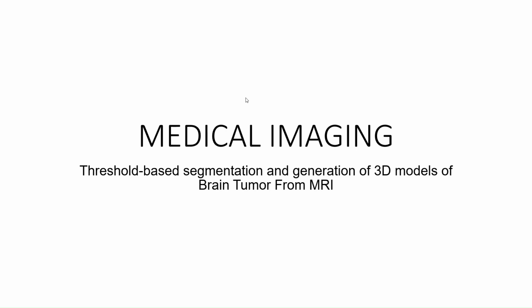This is my medical imaging assignment: threshold-based segmentation and generation of 3D models of brain tumor from MRI scans. In this video, I will be thresholding brain tumors from MRI scans using normal threshold techniques. I will also be using some smoothing techniques to remove jaggy surfaces, and I will show you how to save the 3D model in STL format in Slicer 3D.